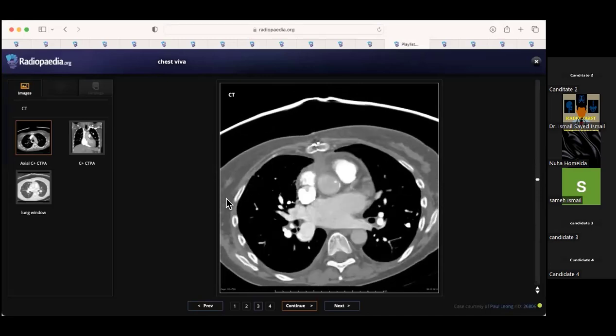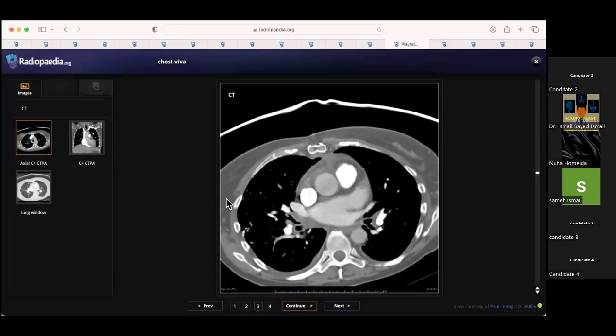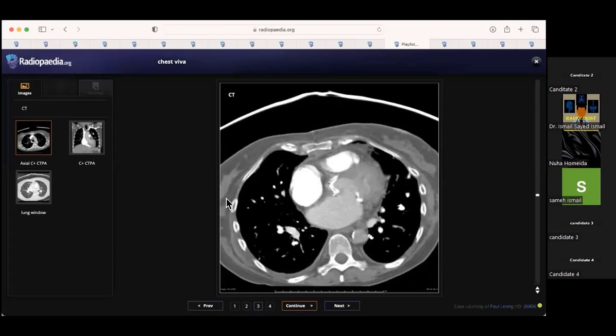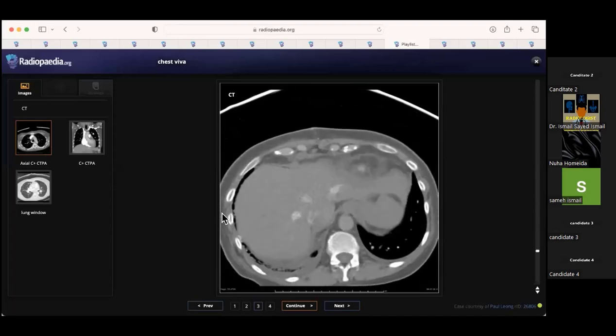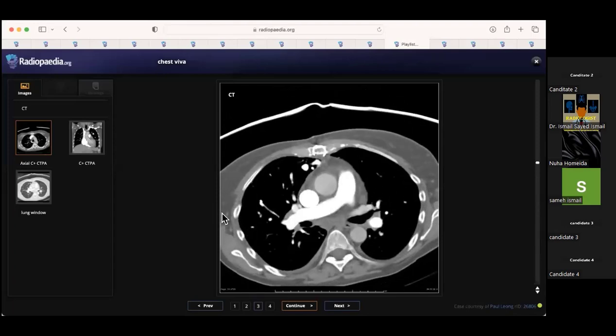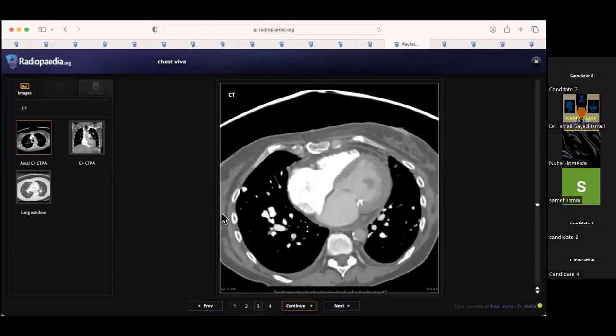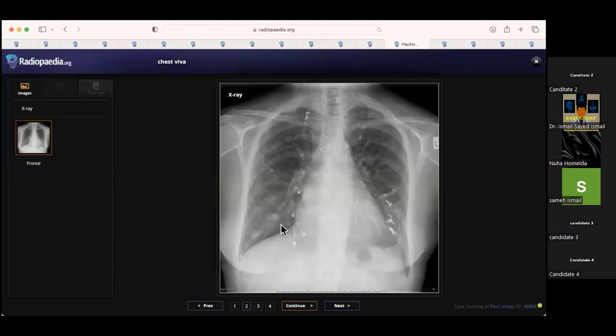If not, I will do ultrasound for this patient to see if there is any AV malformation. Okay, so this is a case of Osler-Weber-Rendu syndrome. There is a very important negative. I told you she presented with shortness of breath. These patients are more prone to pulmonary hemorrhage. This is a very important negative that you should have commented on from the X-ray. That's how they acutely present with bleeding.